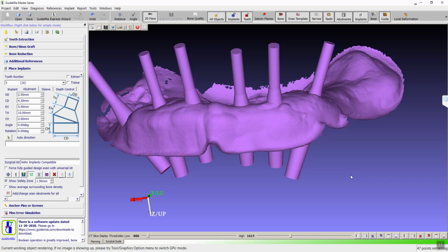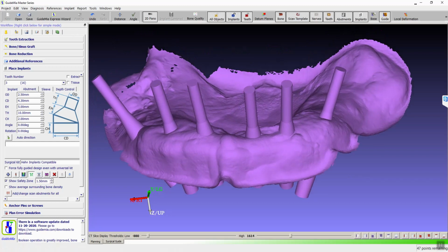All right. You guys want to practice and play around a little bit on your own now? Frank, can you save that real quick, and then reopen it and change the implant? Because when we try that, it keeps saying you can't change it.